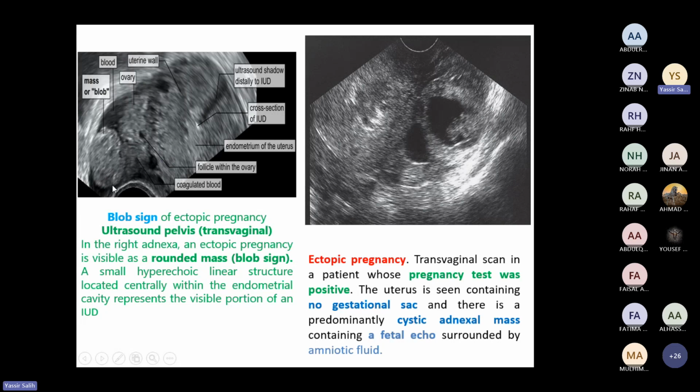فدي بنشوفها في المنطقة بتاعت شنو تحت الاوفريز. اما دي this is transvaginal ultrasound you can see. قالوا البيشنت ده هي عندها كان بوزيتيف pregnancy test يعني HCG بوزيتيف. فعملنا this transvaginal ultrasound.